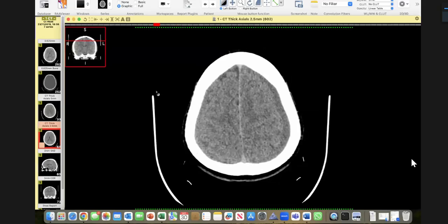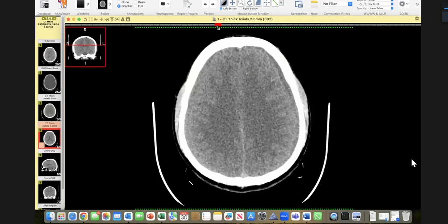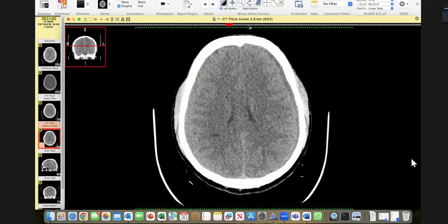So what will you do? Sir, this is an emergency and this patient requires immediate neurosurgical consultation, and if possible, then we should go for MRI with contrast to see the extension and the cause. What are the neurosurgeons to do right now? Sir, this patient has impending risk of herniation, so they will clinically assess this patient since there is generalized cerebral edema. How will the neurosurgeons make a decision on this scan? Sir, since there is generalized cerebral edema and effacement of all the basal cisterns, there is raised intracranial pressure and papilledema.